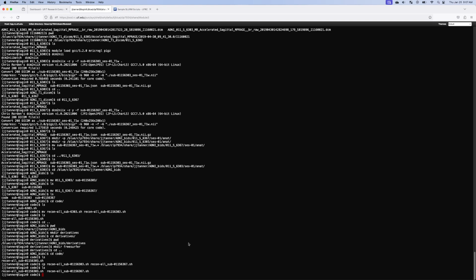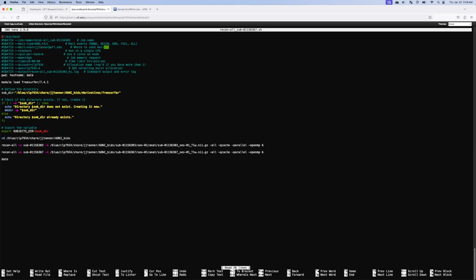Now, I'll show you a different way to edit it. For quick edits, what I usually use is a software called Nano. So I'm going to do nano 6367 and tab to complete, and this will open it in here. You can't point and click with a mouse. It's all just arrow keys up and down like that. It's a little counterintuitive in many ways.